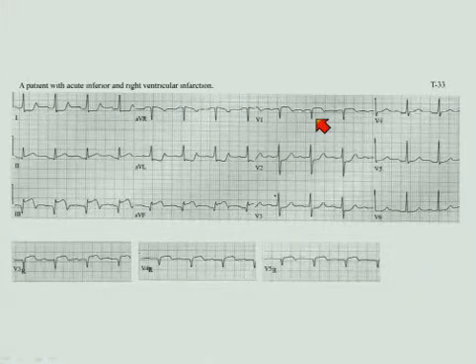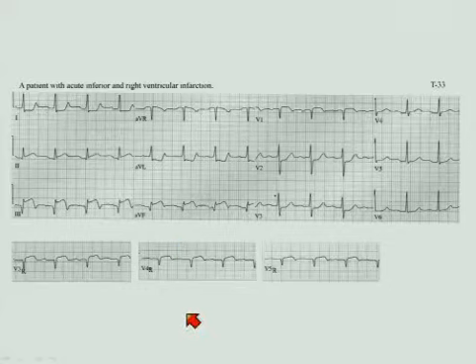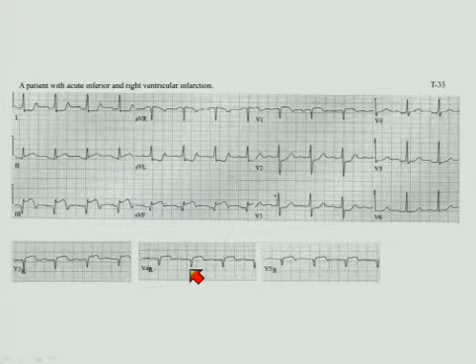you should do the most specific tests, though, which are the right precordial leads. And in studies, the most definite diagnostic criteria is 1 millimeter or more ST elevation in lead V4R, which you see down below.